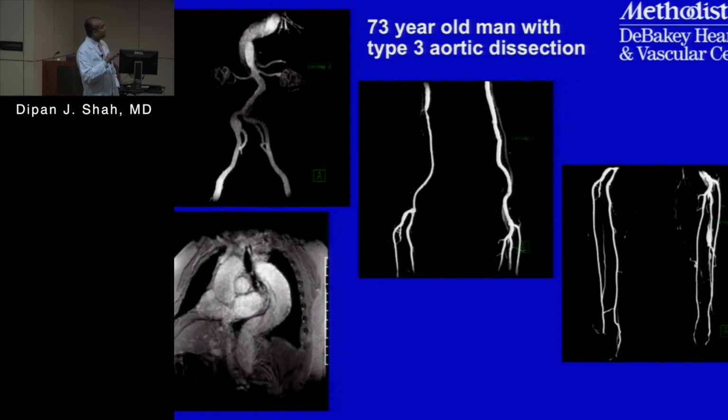Right. So it looks like there's a focal stenosis with just diffuse narrowing of this segment here, right? But on the left leg, what is that? This one here? Which one? Like that outer rim you're seeing, like the SFA? This right here, you mean? Yeah. Okay, so that's a good observation.